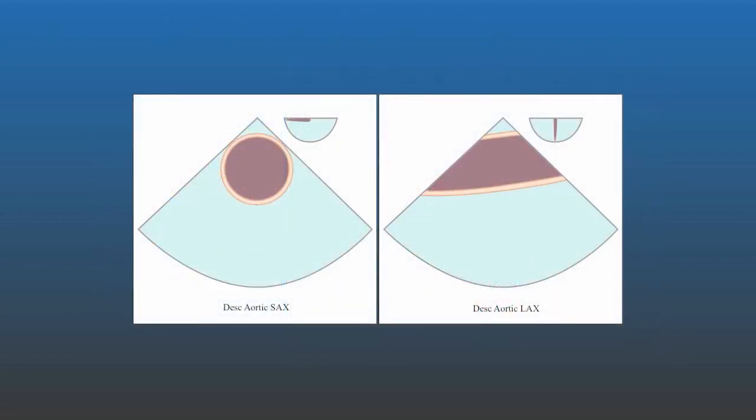While the HeartWorks simulator is not equipped to provide imaging of the thoracic aorta, this can easily be obtained in vivo by advancing the probe from the arch position or rotating the probe from the mid-esophagus. Imaging should be done at a scan depth of around 7 centimeters and conducted throughout the length of the aorta until it disappears from view around the level of the diaphragm. At 0 degrees, the short axis is seen as a circle, whereas at 90 degrees, the aorta appears as a tubular structure. This is precisely opposite to the angles for imaging the aortic arch.